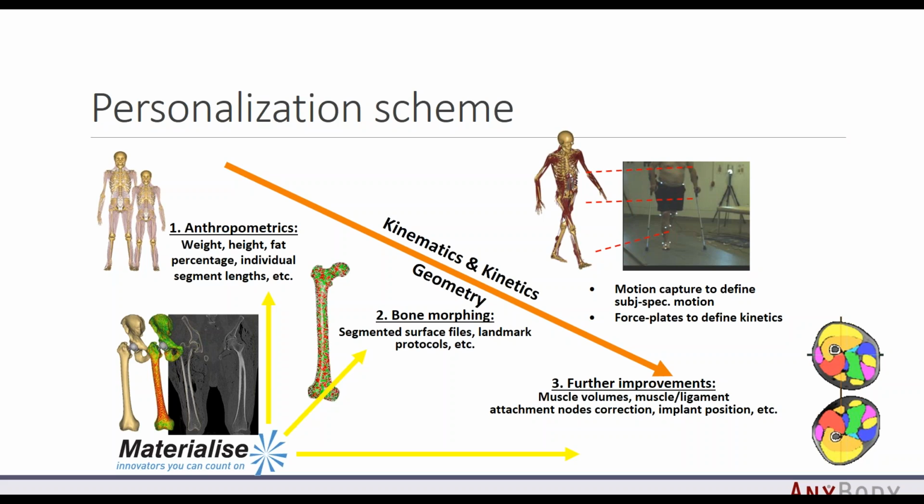And this scheme just once again highlights the workflow. So we start from the full body scale, go to the bone level, and then we go and change the muscle attachments and other small details.